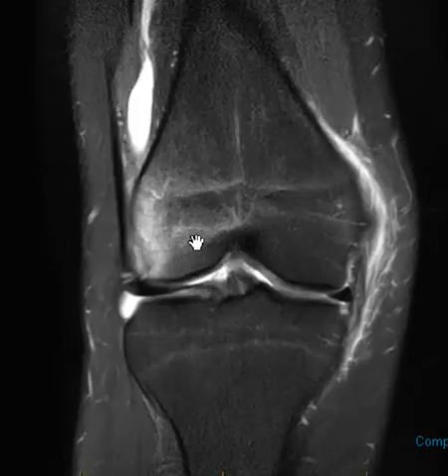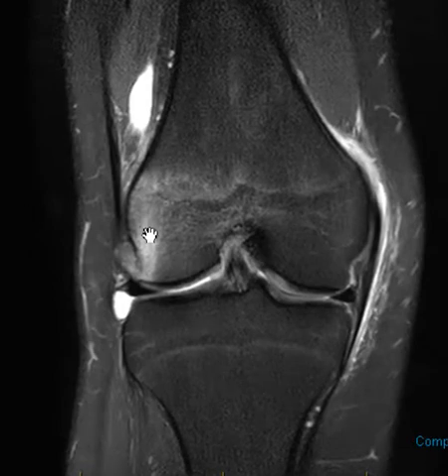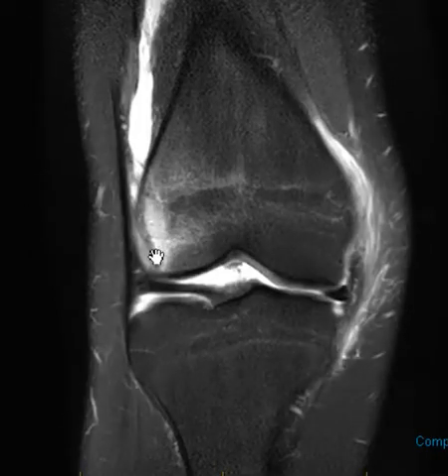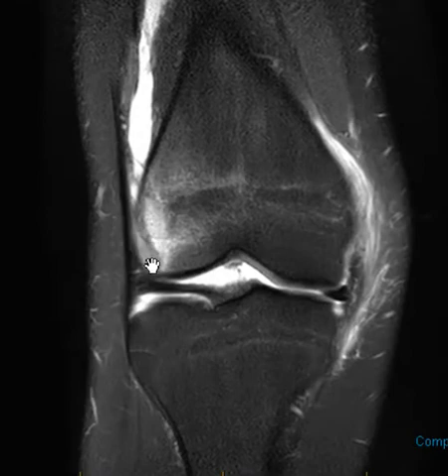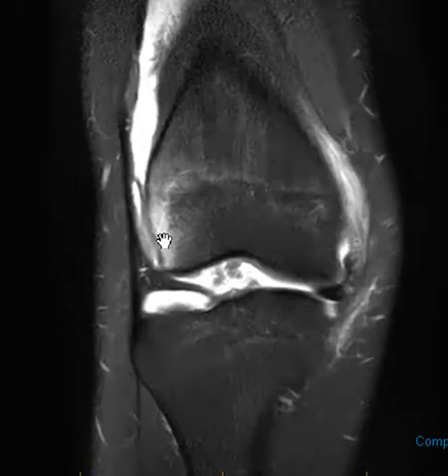You see this? You know that's got to be patellar dislocation. I guess it could have a direct impaction injury, but this is just a classic look. So transient patellar dislocation, the kneecap dislocated, smacked into here, popped back to normal position. We get a little bit of cortical depression sometimes like this. It's concave rather than outward convex, with underlying marrow edema.